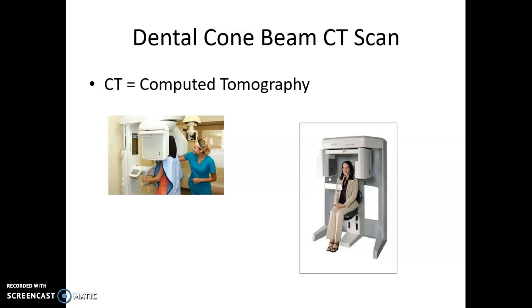In this video, I'm going to review dental cone beam CT scans. CT scans are something that we've seen hospitals use in imagery for a long time. They've used it for decades, but it's relatively new in the dental field. Probably in the last 3 to 5 years, we've started seeing dental offices and specialty offices start to use CT scan technology.